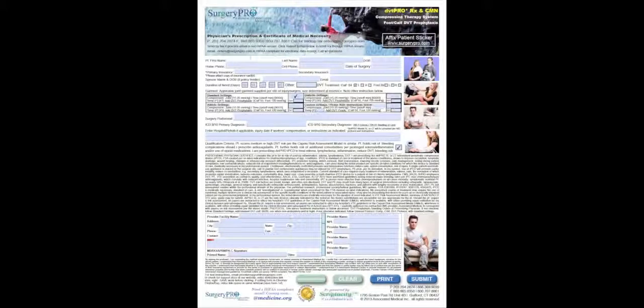Now, moving through the document. If I place my cursor in the first name field and start typing, so let's call this person the very creative name of James Smith, I can tab through. You get the idea. I can tab any. All these fields allow me to type however I'd like, and tab, tab, tab. Say that I want Mr. Smith to have the unit for 14 days. I use the space bar. So I'm tabbing between fields, and I'm using the space bar to select an item to be on or off.